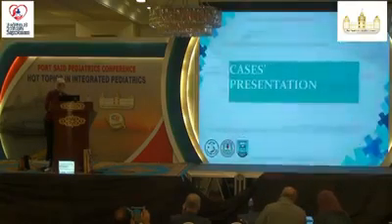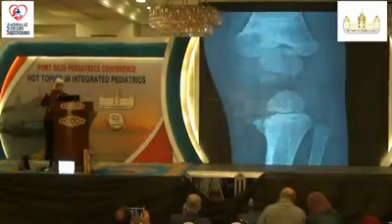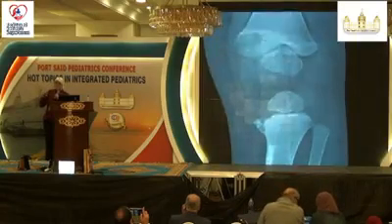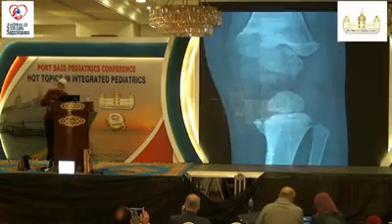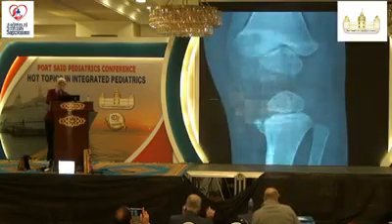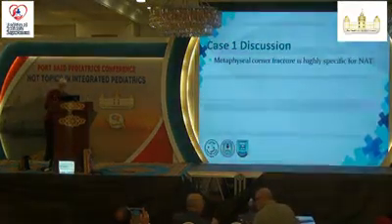Let me show you the cases. This is case number 1, a young child, X-ray at clinical suspicion of rickets. Here is the corner metaphyseal fracture, which is very specific for child abuse. So when I write this sign in my report, you should go back to the child again and look at the clinical presentation and the surrounding circumstances. This is very specific. Metaphyseal corner fracture is highly specific for non-accidental trauma.